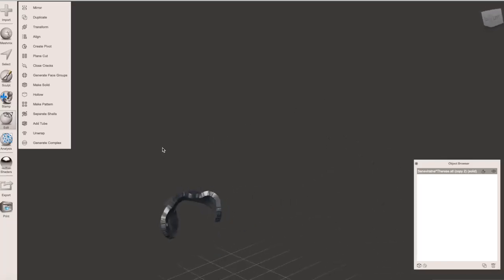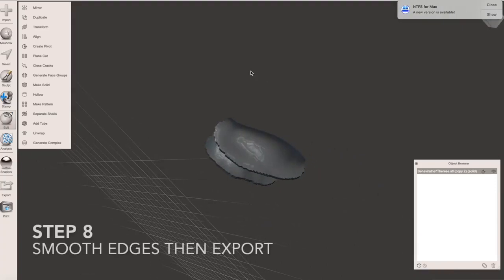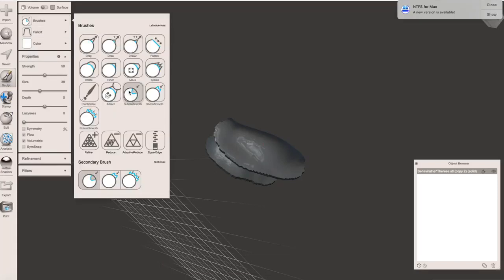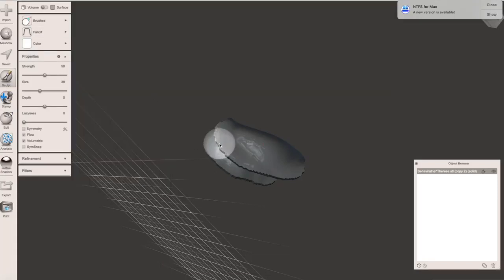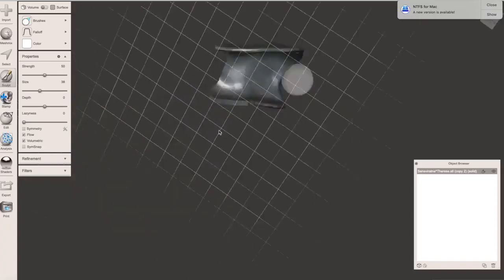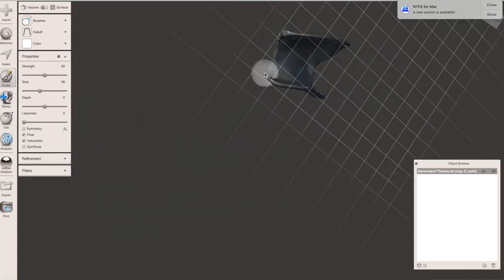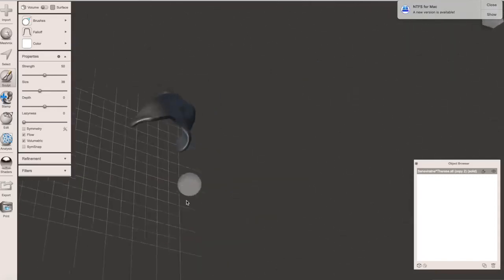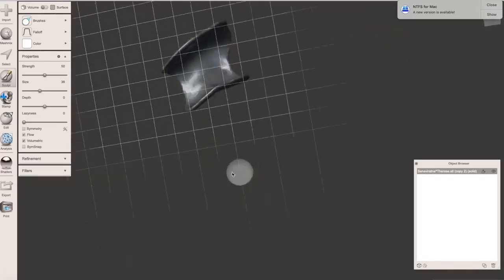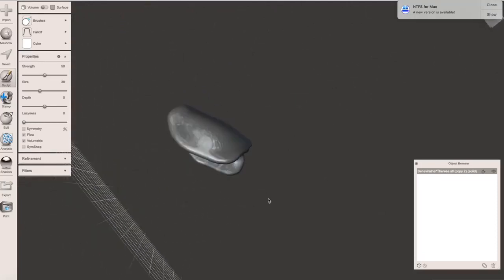So we now have a membrane that is an overall shape of what we want to create with the bone underneath, which will give us a gap ready for the bone graft material, or however Pav dreams up we can use this. So smoothing off the edges will just make life easier for the mill rather than having any jagged edges that will just chip away. So I'm just going to over smooth that a little bit, and then we can just export that as an STL. So hopefully create a nice zirconia membrane that should hold things well and be able to be popped off later on.